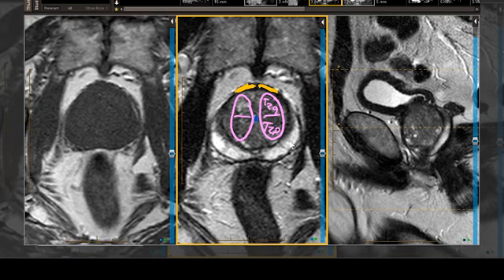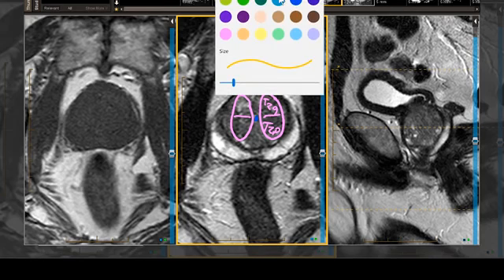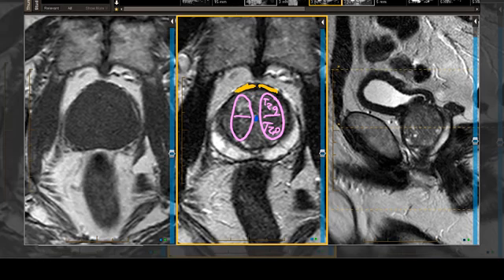And then we have the peripheral zone at the mid-level of the prostate gland. Now, the peripheral zone is going to be divided up into several regions. So let's do that with a little bit thinner pencil, if you will. Let me take a color that works for us. Let's try something like purple. So we've got the peripheral zone. We've got a PZA for anterior, so right PZA for the patient's right side. Then we're going to have a PZP. My writing skills have deteriorated, but there's a PZP. And then we're going to have a PZM for medial or mesial. Both mean the same thing.